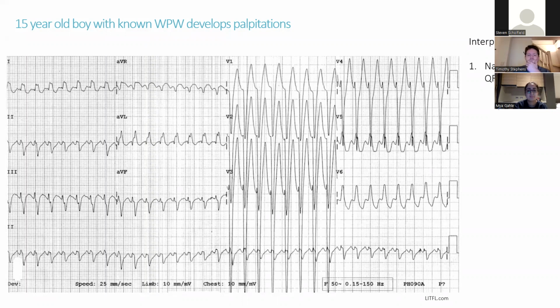Yeah, I guess you could think that. Looking at this ECG, you could say this is narrow. Oh, sorry, it's not narrow, it's wide, of course. This is a wide complex tachycardia. It is regular. There are P waves, well, it's really hard to appreciate them. I would struggle in an emergency situation. P to QRS ratio, I'm not really sure. So what am I going to do with this?